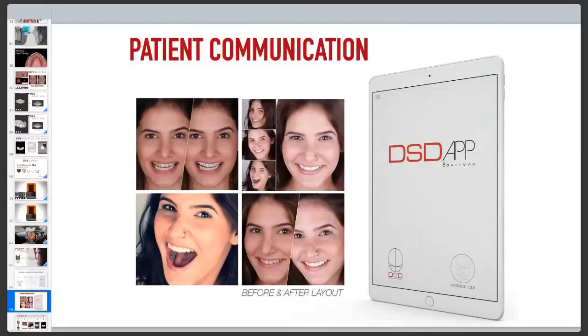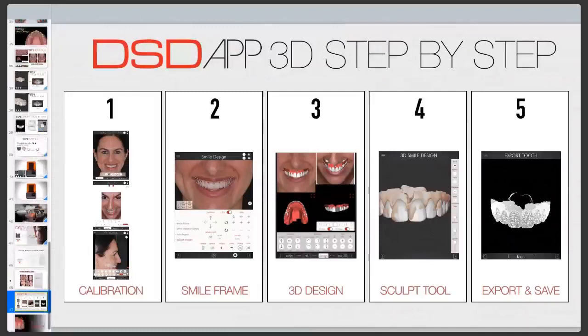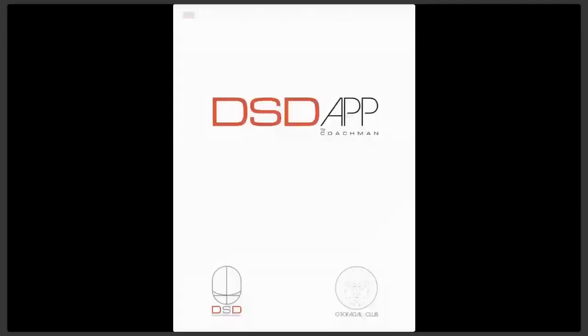So now, before we jump to my iPad screen sharing, I want you to keep this very clear in mind. All the steps that we're going to do right now start with calibration, smile frame, 3D design, sculpt tool, and then export and save. Okay, so let me just switch here to my iPad screen. There you go.